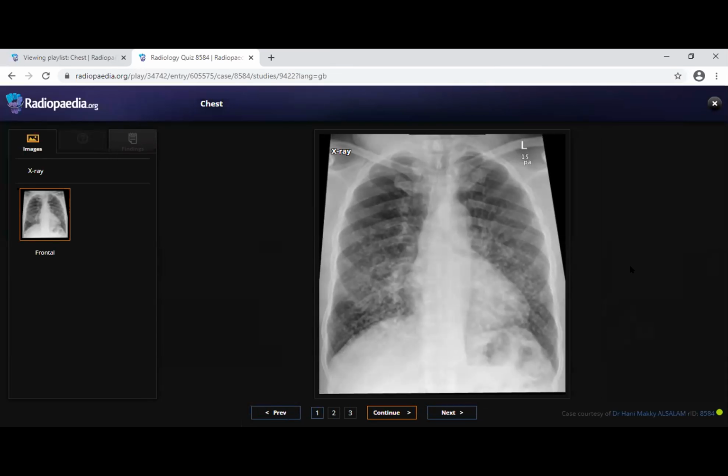Frontal chest radiograph for a skeletally mature adult patient showing diffuse interstitial reticular thickening with small cystic changes, mainly involving the mid and lower lung zones. No evidence of loss of lung volume. No mediastinal lymphadenopathy, no pleural effusion. So this interstitial lung disease with preserved lung volume could be interstitial cystic lung disease. I would like to assess the finding by CT.